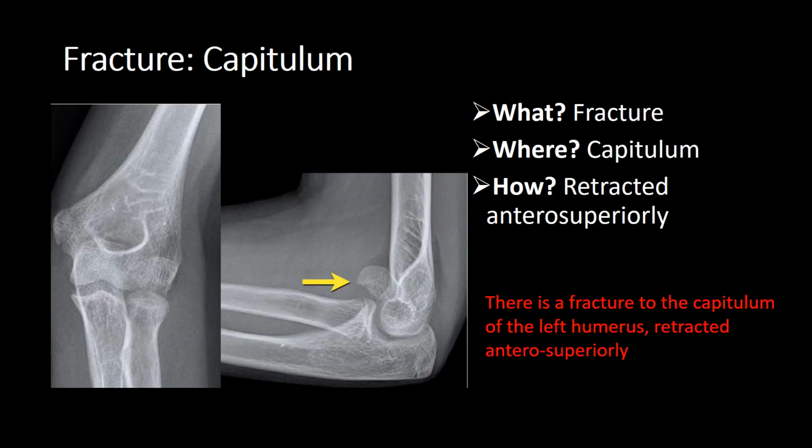So what is it? It's a fracture. Where? It's the capitulum. How? Retracted anterosuperiorly.